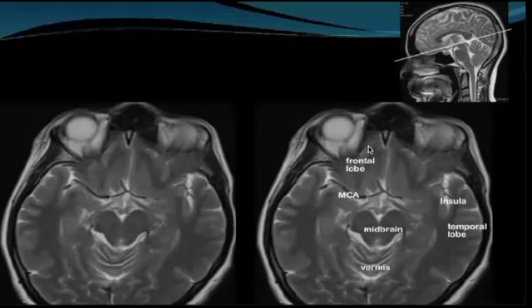And here, most anteriorly, this is your frontal lobe. So again, here we have the frontal lobes, very frontal. This is your temporal lobe. This is the border of the temporal lobe. And interior to the temporal lobe here, we should have the insula. This is the midbrain. This is the vermis from the cerebellum.